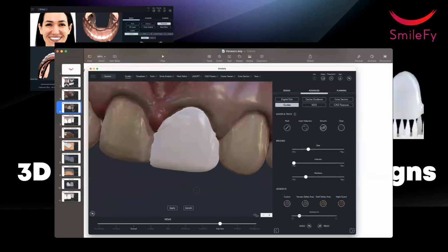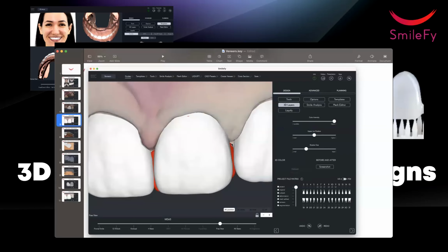One layer is going to be the thickness layer, the safety layer that we set, for example, 0.45 millimeters. And the second layer is going to have 0 thickness, but it's our visual reference for the prep area, which means the contact area between our veneer and the intraoral scan and the patient's tooth, right? You see, when we have this layer, we can check if the thickness is enough to create a veneer, to print or to mill.